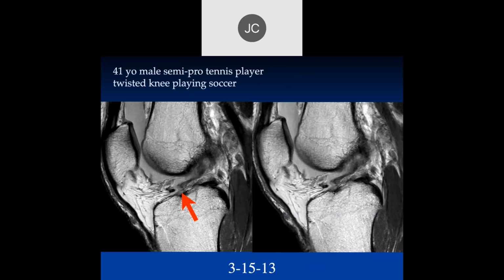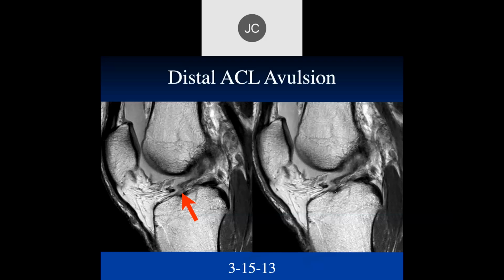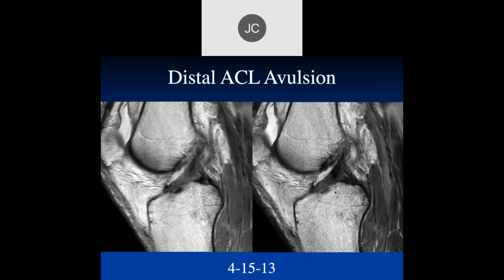This particular person came and we talked about this at length. He saw a very well-known knee surgeon in the area who recommended graft placement. He decided not to do the graft, but to wait and see if this would heal, and he could always do a graft later. So this was on 3/15/2013, distal ACL avulsion.